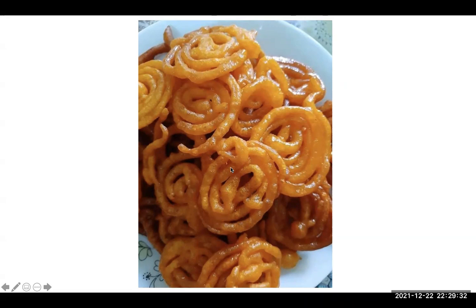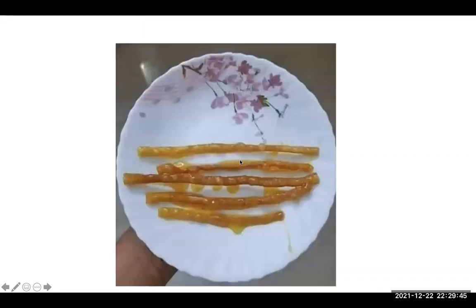After seeing all of these X-rays of the different kinds of pneumonia, I think they are actually twisting in your mind, like what we are doing. So we have to make it straight, just like this, and eat it this way to make it straight. When you practice this kind of X-ray repeatedly in your clinical practice, you will find that it's very easy to diagnose. You just have to practice, and you have to know something. You have to study well.